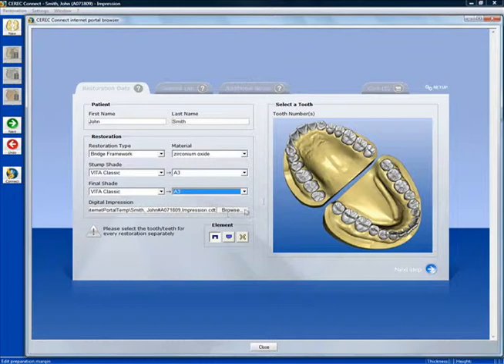Now, we have to click on the teeth that will be restored, and the crown coping element is already selected. When you hover over the tooth, a message pops up to tell you which tooth you are selecting. Now, we click the pontic element and click the corresponding tooth. Finally, we click the crown coping element again and select the final tooth for this 3-unit bridge. Above the model on the screen, the teeth numbers that you selected are shown to you as a reference.